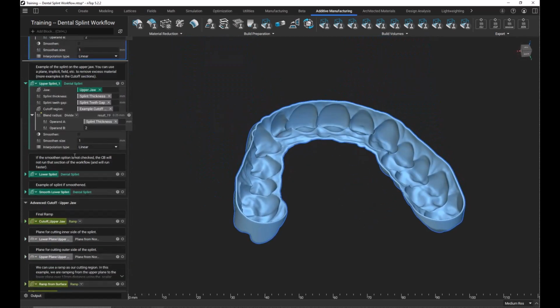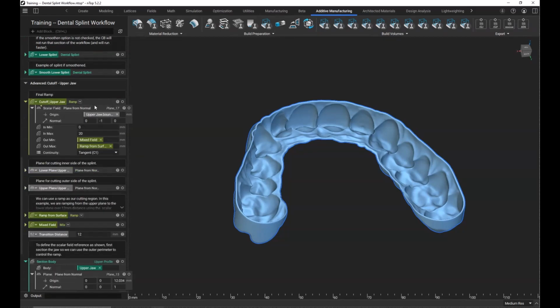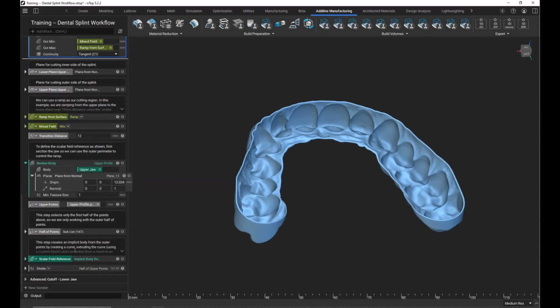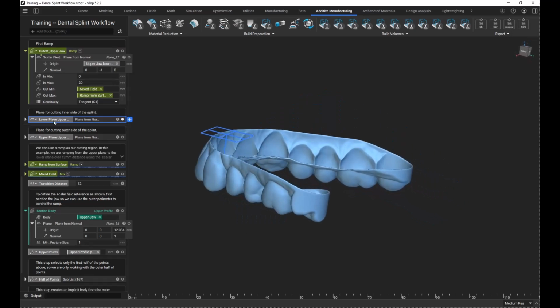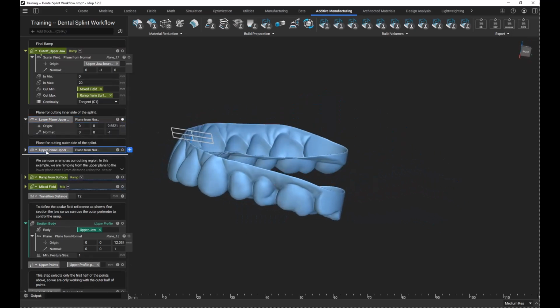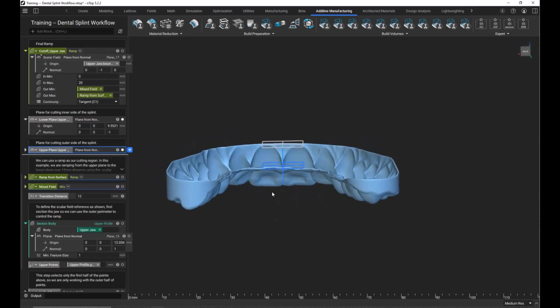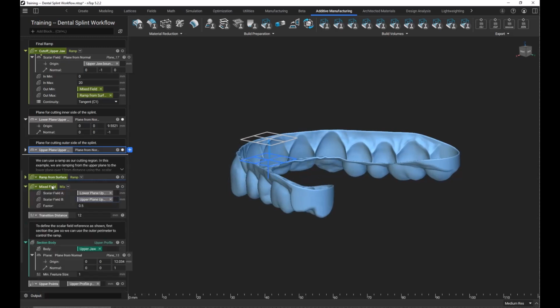And this one is a little bit more advanced, so I won't go into it, that's why I have it in that separate section. It uses our ramp block to basically ramp from the one type of shape and structure that we're wanting to go to from the other. But if we look at that, I have my upper jaw that we have here, upper plane, upper jaw. So those are the two regions of cut planes that I want to do. And I basically mix between them.